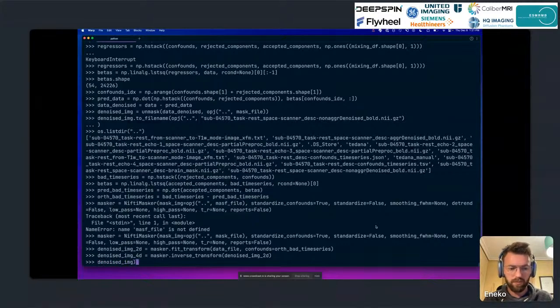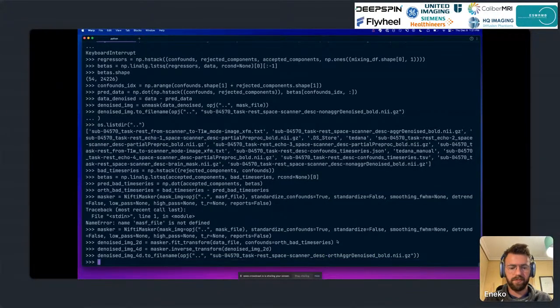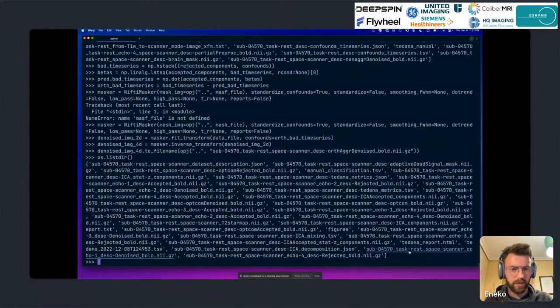Define it. And again, I'm going to put in the folder above and copy the name. I'm going to call this orthogonalized aggressive denoise. There you go. And it should be somewhere here now.